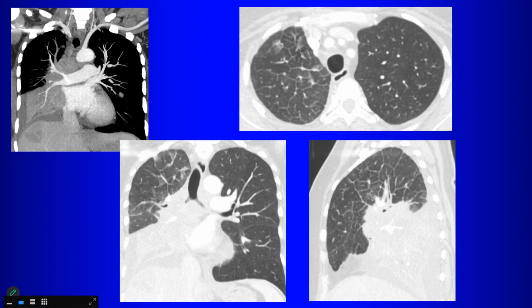So how do we interpret that? Lymphangitic spread. So one concern is lymphangitic carcinomatosis, right? Certainly lung cancer can give you lymphangitic carcinomatosis. The classic appearance of lymphangitic carcinomatosis is what? Nodules. Nodular thickening of interlobular septa. Is this nodular or smooth? This is pretty smooth. Now, lymphangitic carcinomatosis can give you smooth thickening also, so that is still a consideration.